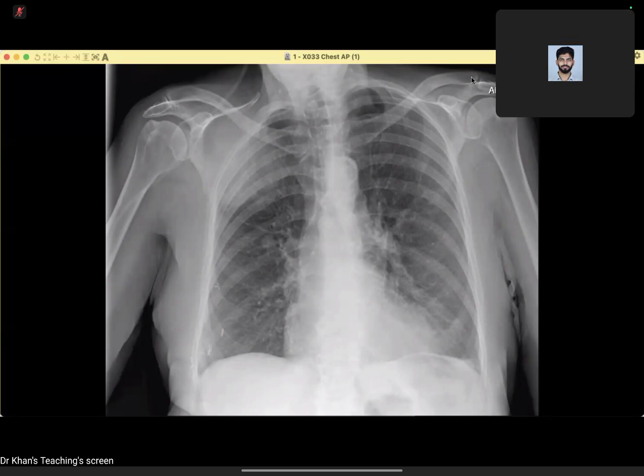Provided is a frontal projection radiograph of the chest in a skeletally adult female patient. The striking abnormality I can see is an area of ill-defined opacity, which is projected over the right upper portion, which is broad based toward the chest wall and projecting into the lung parenchyma.